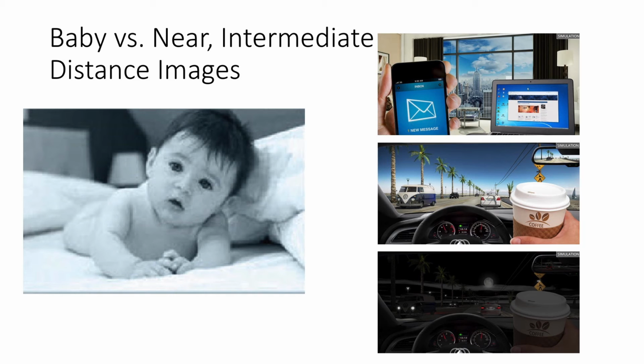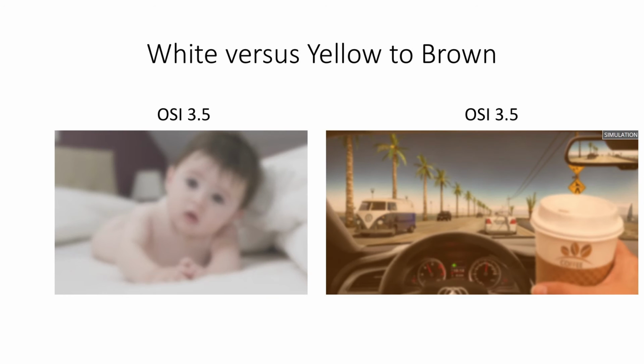However, instead of using the baby picture, we created 2 scenes to simulate vision that include a near, intermediate, and distant object. There's also a night scene that can be used to discuss ocular scatter's effect on nighttime driving. We also changed the clear to white clouding simulations used over the baby image on the HD Analyzer to a yellow to brown clouding over our images so that it is more representative of cataract development.